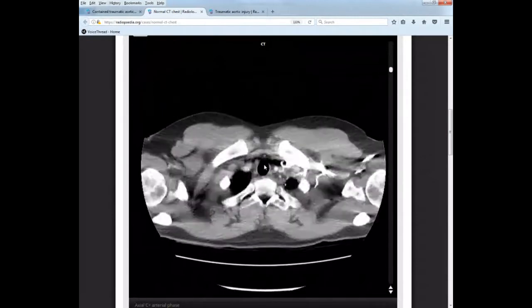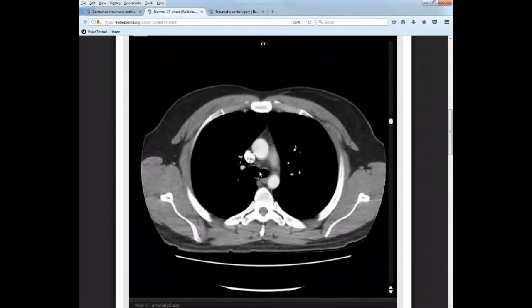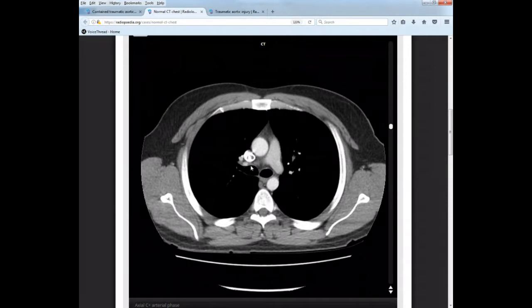So trachea coming down, coming down, coming down, and then there's your carina, okay? There's the first bifurcation. Remember we looked at the right main stem bronchi, and it almost immediately branches off laterally, and then the left doesn't branch quite yet, but it does make a left-hand turn and moves over and travels a little bit more horizontally. So how that's going to look on a CAT scan is our right main stem bronchi is more vertical, so we should see more of a complete circle of our right main stem, and our left is going to start to become oblong because it's traveling in the left direction.